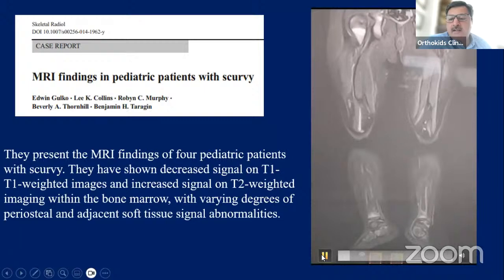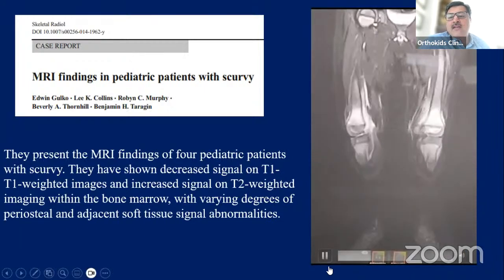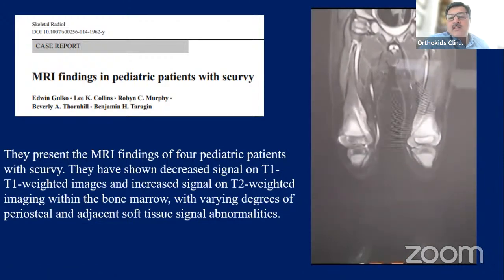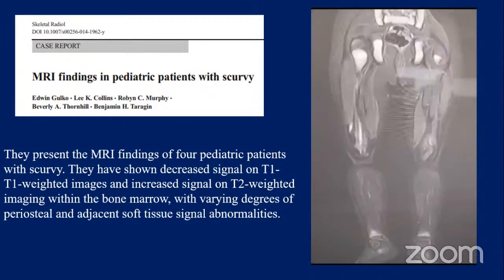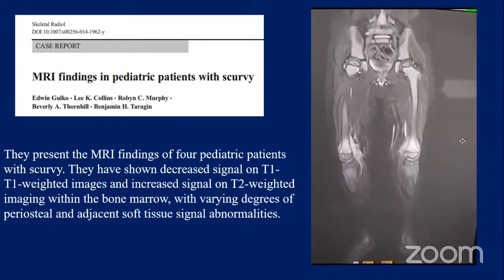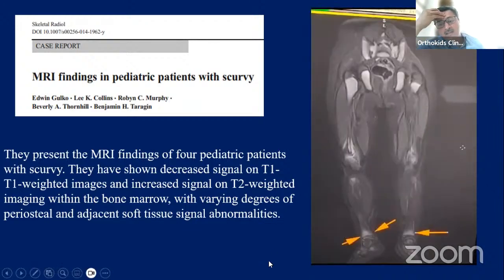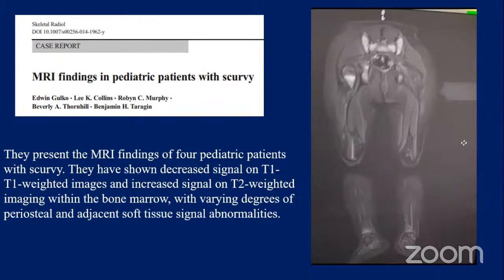Yeah, so our radiologist sent this video. This is how scurvy looks on imaging. There is marrow edema near the physis, some periosteal reaction because of the subperiosteal hemorrhage. And I would share a few articles on current day scurvy. Anyway, so sometimes this is again a tumor mimic.